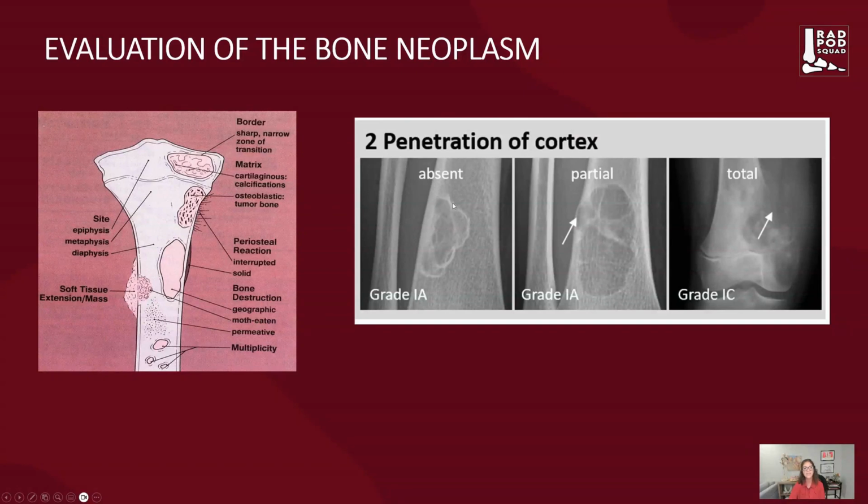In this case, we can see again our wonderful 1A sclerotic, very well-defined lesion consistent with a benign lesion. Now we begin to see that there's some expansility to this portion, and it is still intact. We don't see a pathologic fracture, so we'll be looking to see how much expansility, and if it's not greater than the length of the lesion, this is still on the order of something that can be benign, as something that can be seen in non-ossifying fibromas.